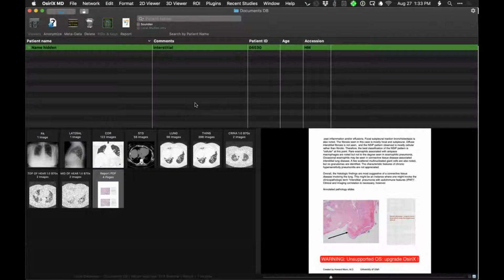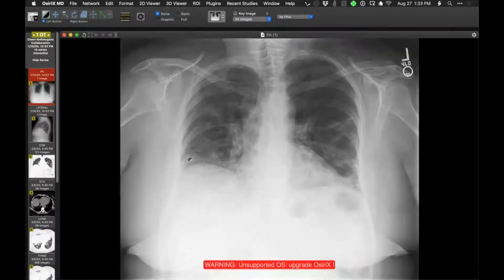So this is a nice opportunity for rad path correlation. Here is the chest radiograph of a person showing mostly basilar abnormality in the chest. These opacities are obviously subsegmental sized. And having a chest radiograph like this, you wouldn't be able to make any kind of diagnosis other than to suggest some form of lung disease is present, but we don't know whether it's acute or chronic. What may be atelectasis, what may be consolidation, what may be neither, some kind of fibrosing disorder or combinations thereof.